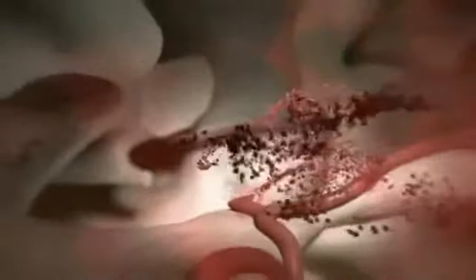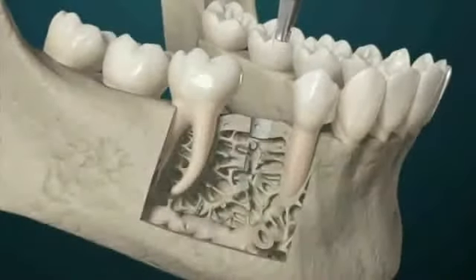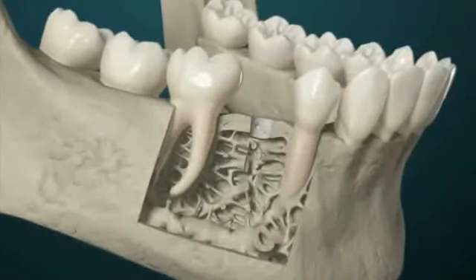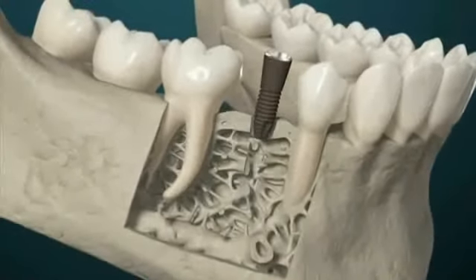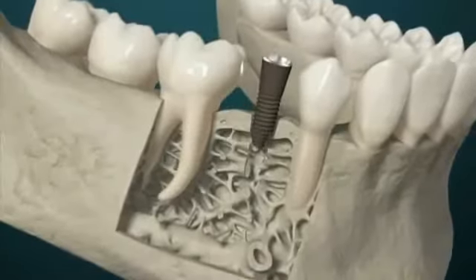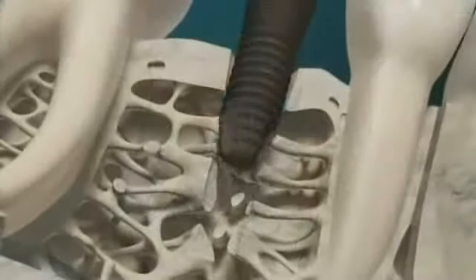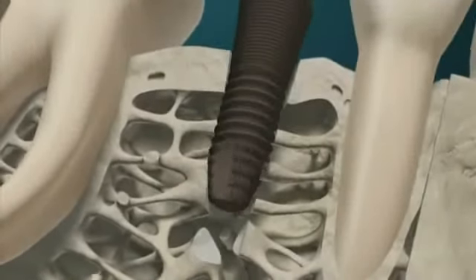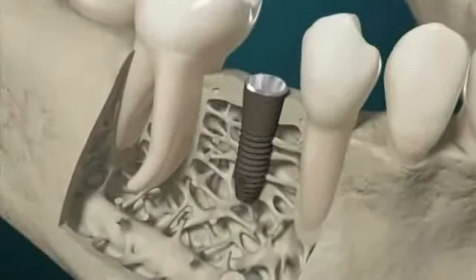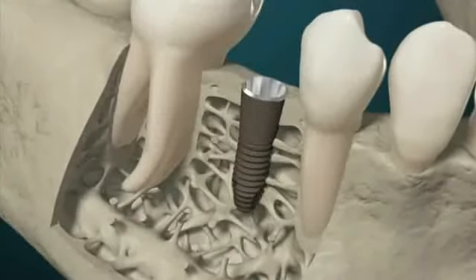The titanium implant is inserted where the tooth was previously lost. At first, the only force holding the implant in place is mechanical friction. This is called primary implant stability. Osseointegration, or secondary implant stability, requires a highly complex sequence of additional biodynamic processes. This is facilitated by finely tuned communication between the main actors of wound healing, the cells.